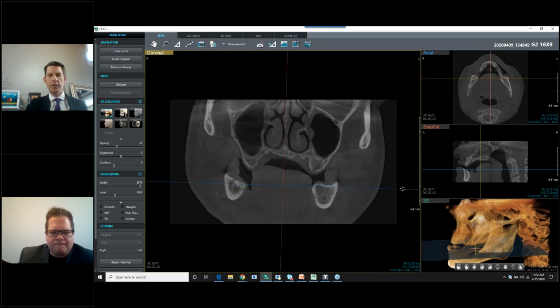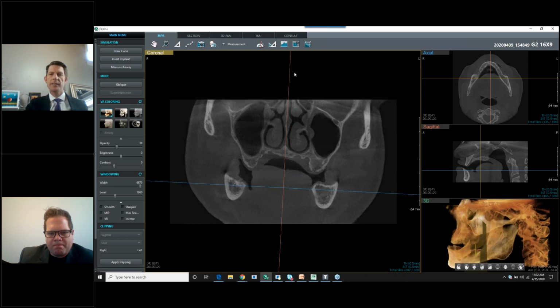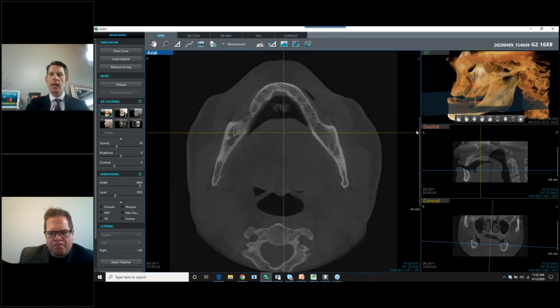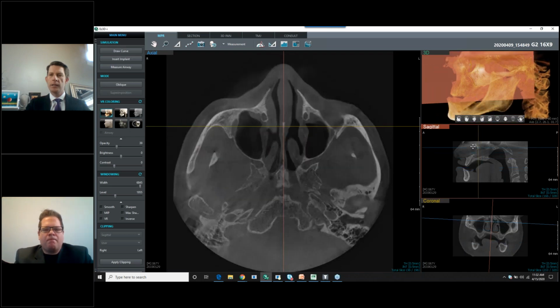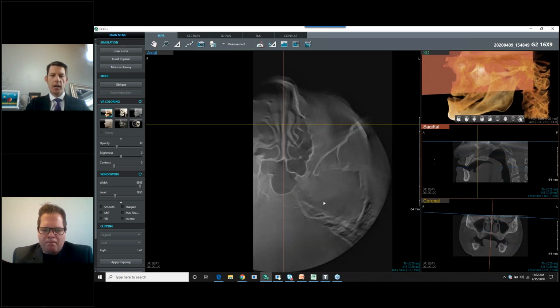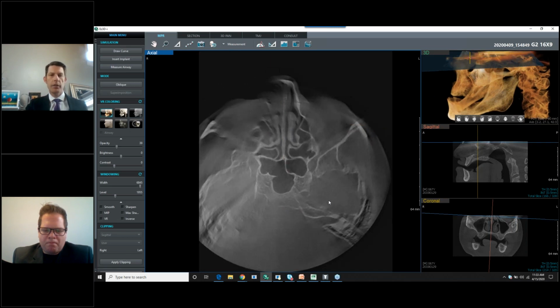Two different points that I could rotate to get this center. I can go to the inferior border of the mandible, or I'm going to use a little mylohyoid ridge right here, get that lined up. And now see how we have our angle, or our center sagittal slice centered there. I'm going to right click on my axial window, switch to main view, and we're going to bring this up to the superior border, just like Paul did on his 8x8, and we've done every week. We wanted to look at the patient's overall dental health.